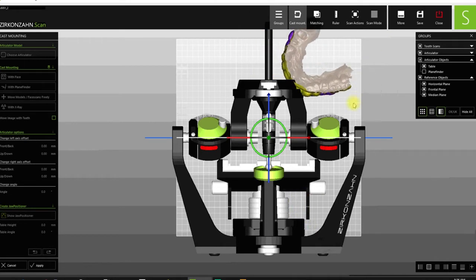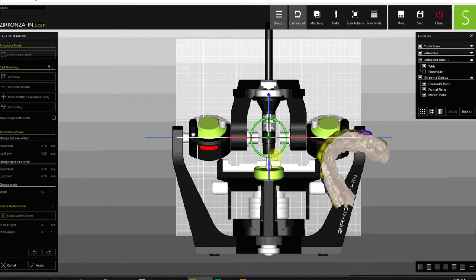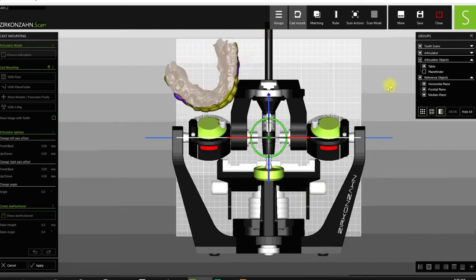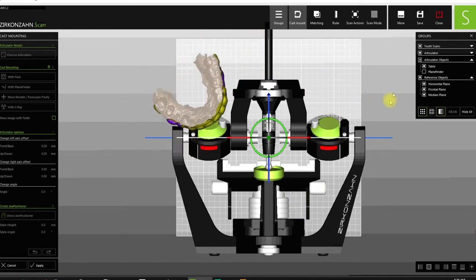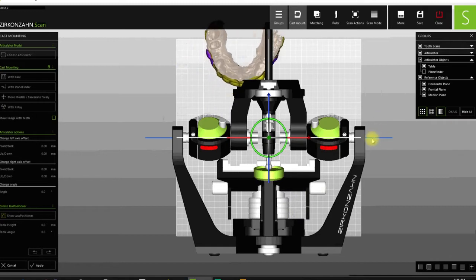And interesting point here. I used to think that you had to grab this little circle and work it around. You don't have to do that. Just grab one spot and then move straight away from it, and it'll just continue to rotate. You see that I'm just in a straight line. So that's pretty cool. So I want to get rid of, this is the yaw I'm doing right now. Use your little plane. You see that this plane right here that I brought in, that can help you line this up right now. So, try to get this thing straight up and down right there.